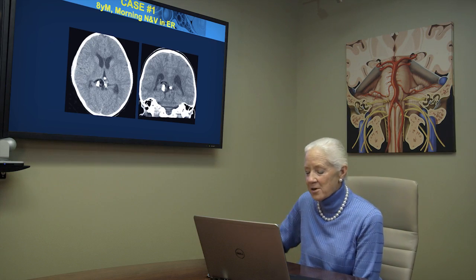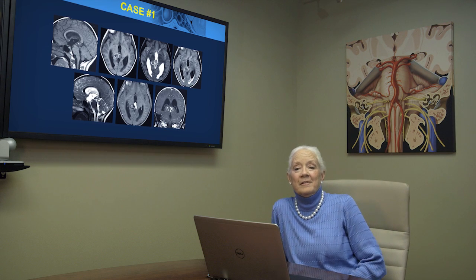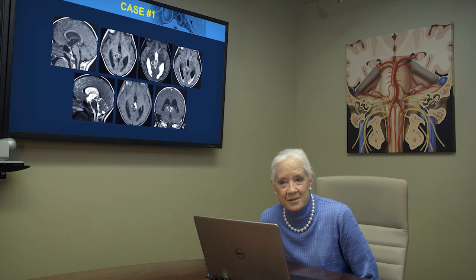Well, an MR scan was ordered, and here are some representative images. We see that this complex appearing mass has areas of short T1 in it, as well as calcification, definitely some cysts. With the FLAIR scan, we can see the obstructive hydrocephalus and the periventricular accumulation of interstitial fluid, cysts, and some moderate enhancement of the mass. More information, but we're still left with wondering what this is.